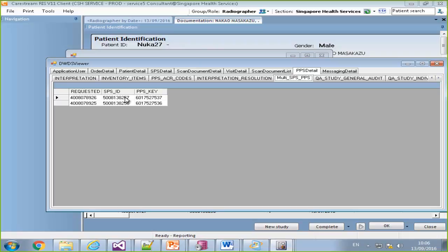I think that in your hands-on, maybe you can try to change those skip copy fields to see that it's copying and it's not copying. There's a lot of logic behind it.